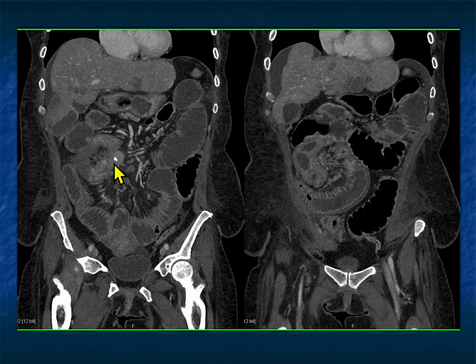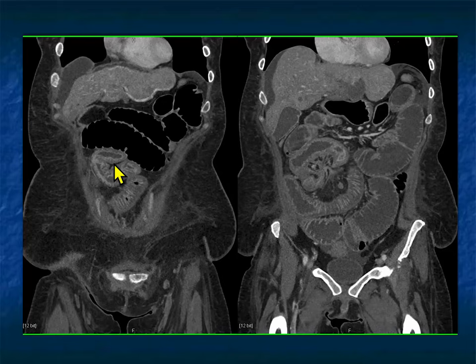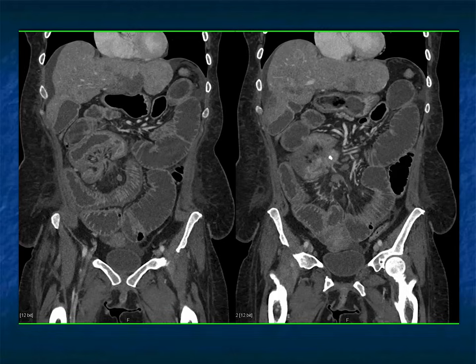So when you're thinking about bowel obstruction and you're thinking about carcinoid, look for masses in the bowel that may not be the cause of obstruction. The desmoplastic reaction is often what's going to cause the obstruction, but there may be a mass more distally in the small bowel. And so carcinoids are a little bit different. It's that combination of tumor and the patient's desmoplastic reaction.